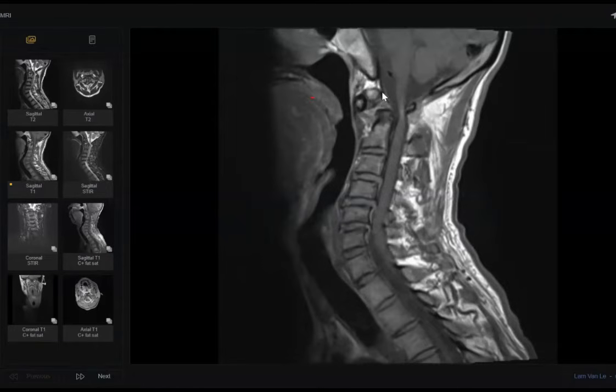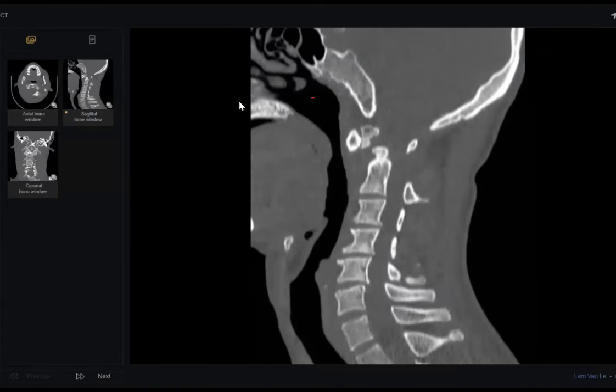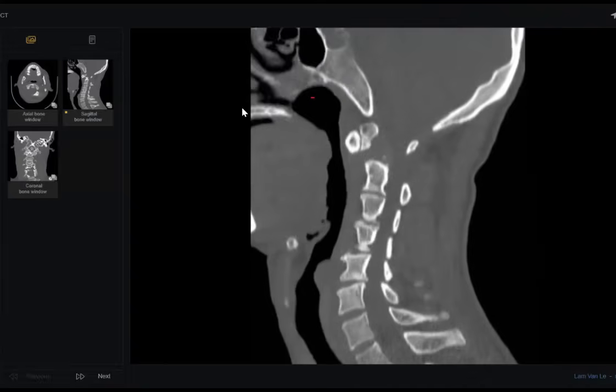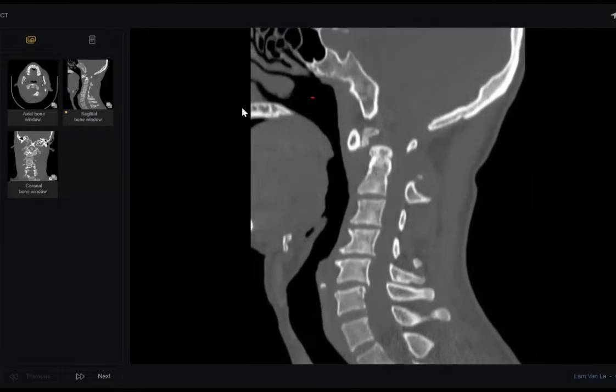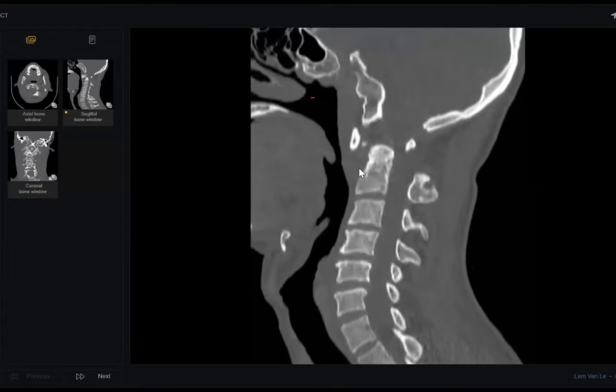It may be arthropathy, but that must cause some erosions here and here, aggressive inflammation. Look here, this is an unfused os, not a fracture because it has a cortex.